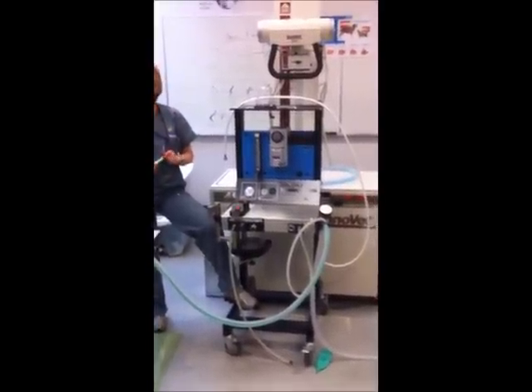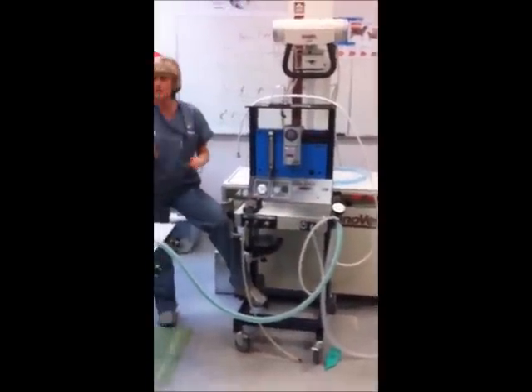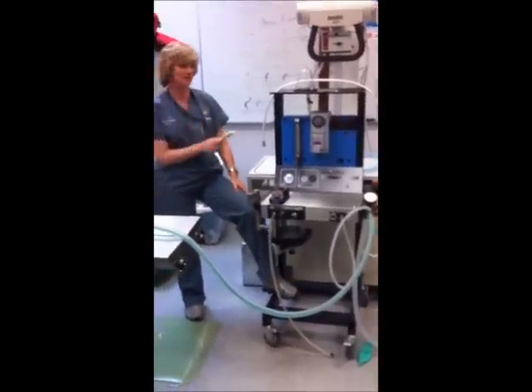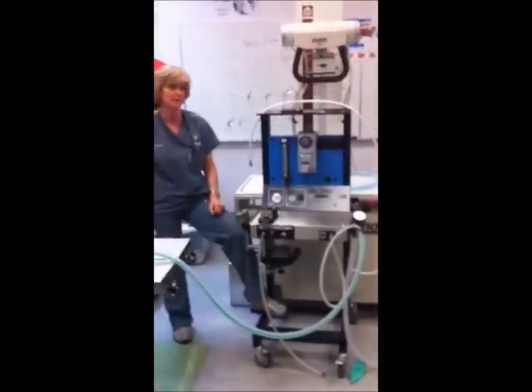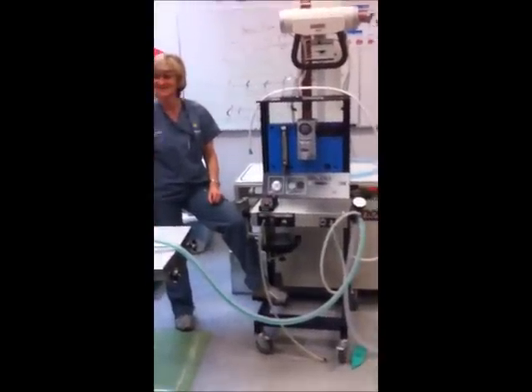Are those the tubes that you're gonna have? Yeah, I'm not going to put different tubes out. Now that's not good because really, I really shouldn't have you, because you're going to know one's blue, one's green, and that's not reality out there, but I'm not going to try and trick you that way. Okay, good. Unless I change my mind.